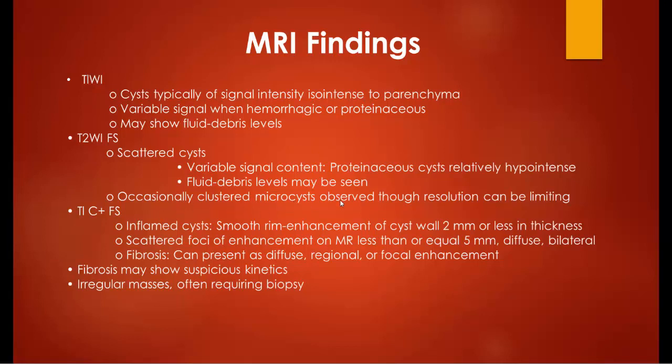Occasionally clustered microcysts are observed, though resolution can be limiting. T2 with fat suppression, fat saturation, scattered cysts present with variable signal content.